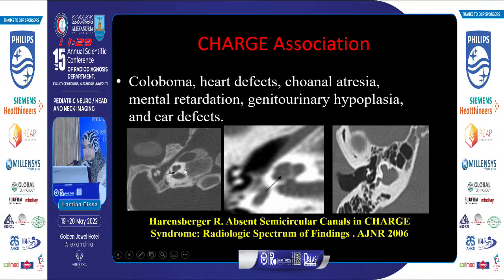This image shows an isolated or trapped cochlea, which means there is absence of the cochlear aperture, which connects the internal auditory canal to the cochlea. This may be overlooked if we are not intent on looking for this anomaly. Also, there is a very mild modiolar deficiency, a deficiency of the posterior strut of the modiolus, while the anterior strut is very well developed. This is a minor deficiency which could be overlooked if we are not looking for these anomalies.